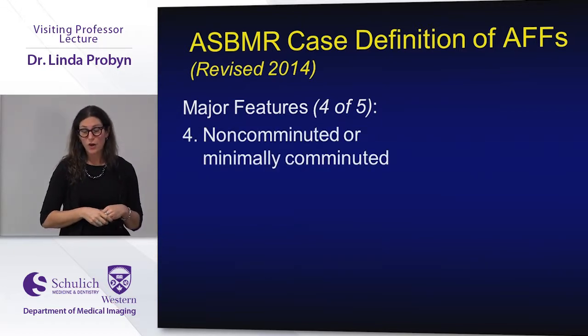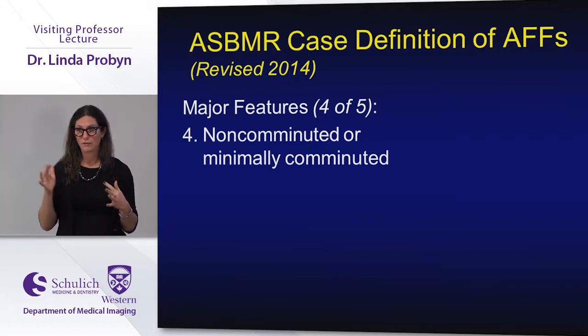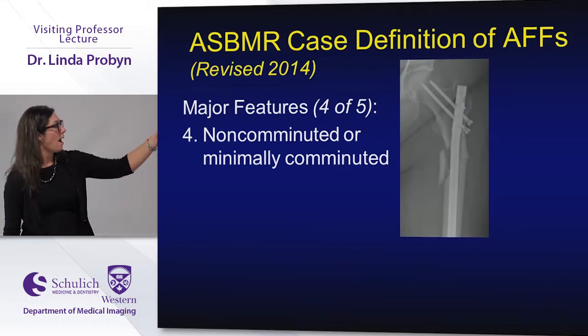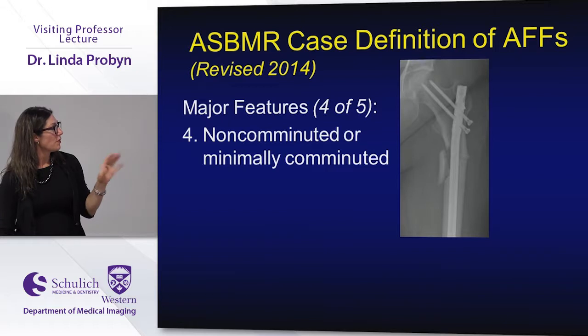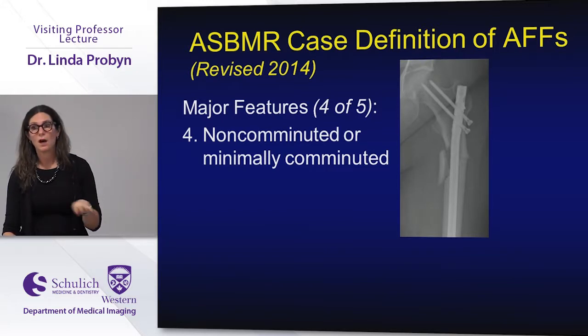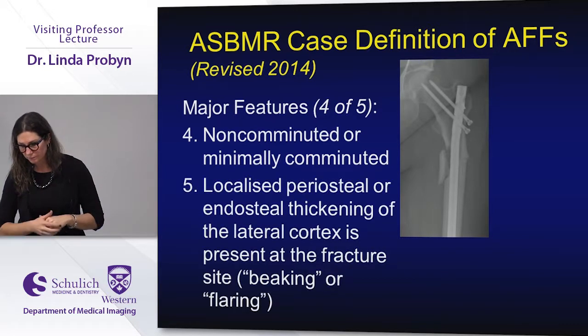These fractures are non-comminuted or minimally comminuted, and I actually only have one example of a minimally comminuted one to show you, and they've already been fixed. So you can see there it's a little bending wedge fracture there. So that's my only example I have of a minimally comminuted. All the rest I've ever seen are just simple fractures, non-comminuted fractures.